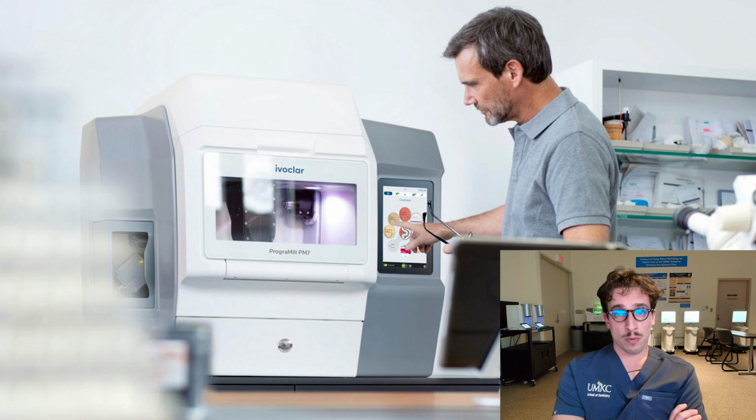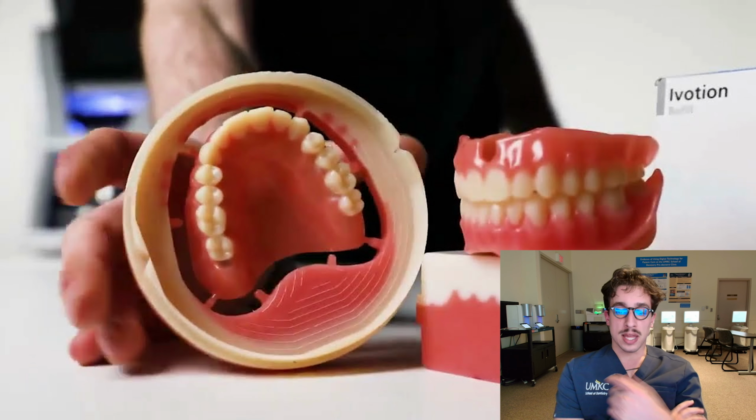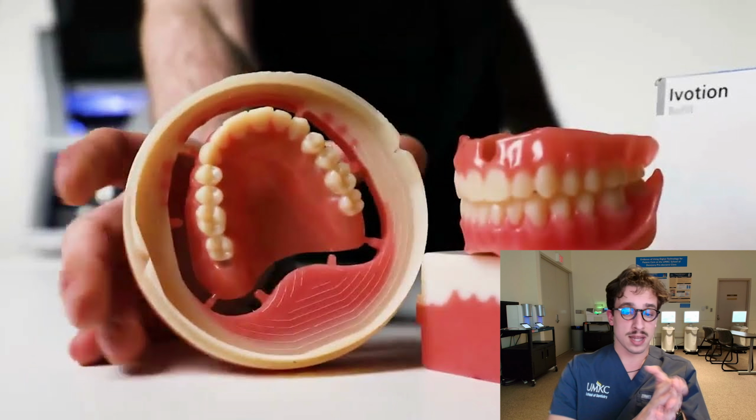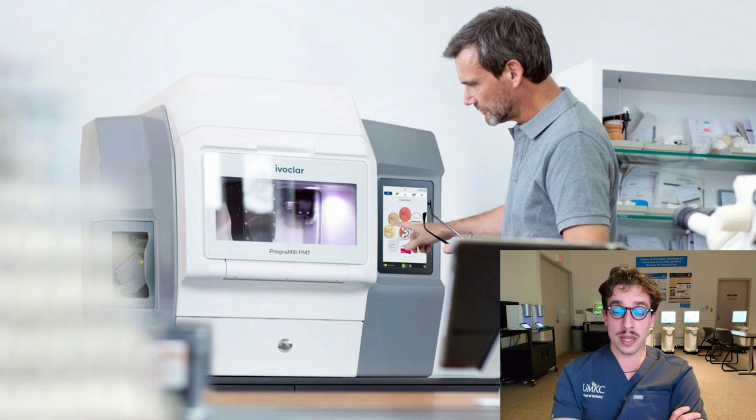The majority of the time we'll be milling it out of a monolithic block, which you can see here, where it's one block that has a side for the gingiva, has a side for the tooth shade, and then it mills it all in one piece. And it's a really, really impressive way that they're able to do that. I won't go into the details for that because it'll probably bore you, but just trust me, it's fascinating. And then for the actual milling process itself, again, you need to watch the video that I'll have on here of the milling process that goes through it step by step before you come up to mill it with anyone in the lab.